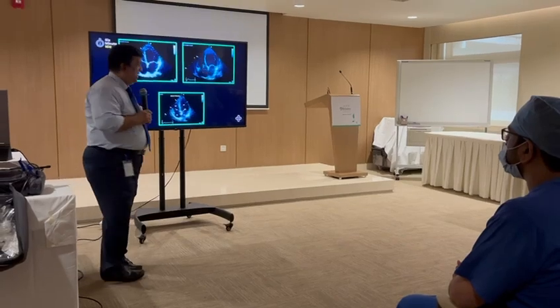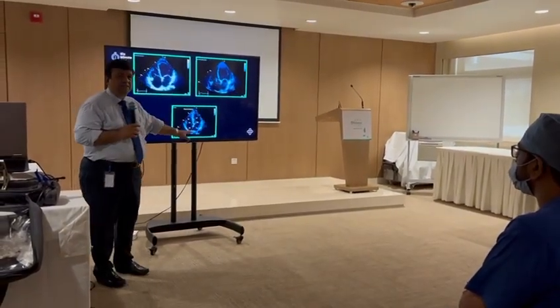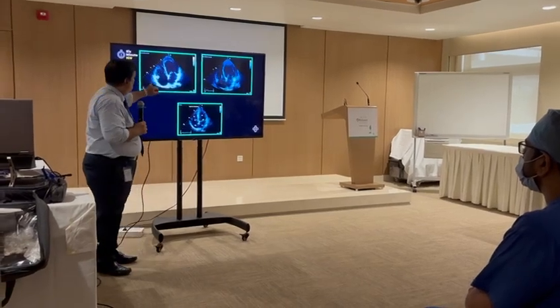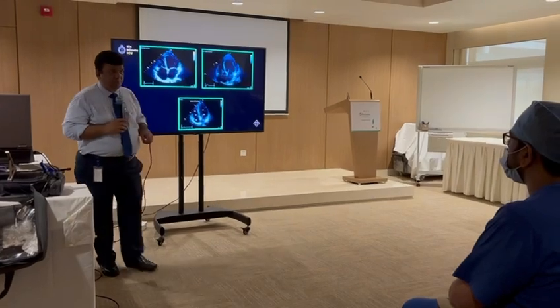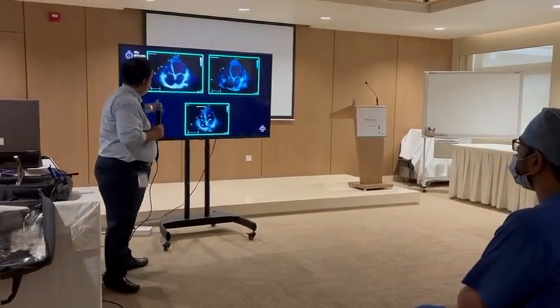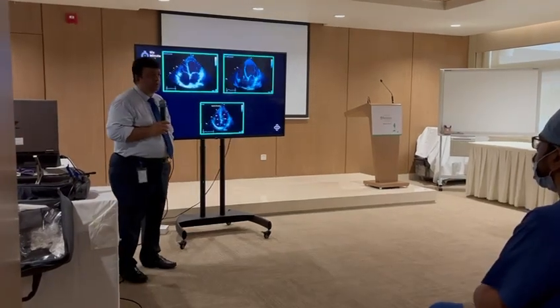Okay. Now we've got this video here, for the sake of understanding this is normal. Tell me, good, moderate or poor? Poor. Think and tell me. What would you aim it as?